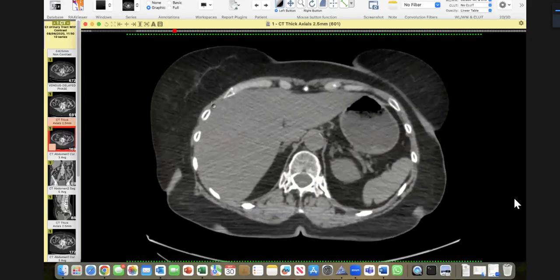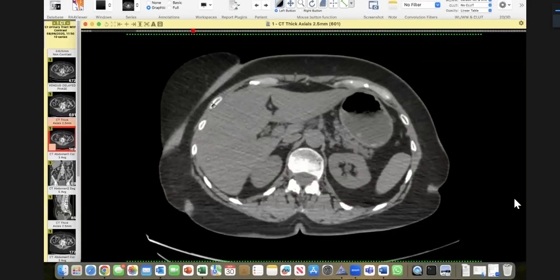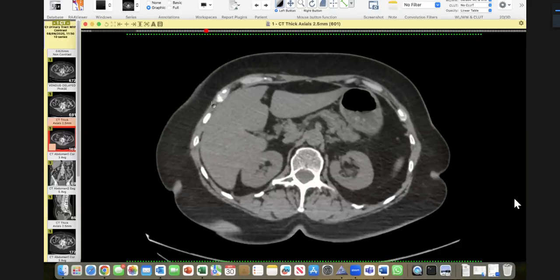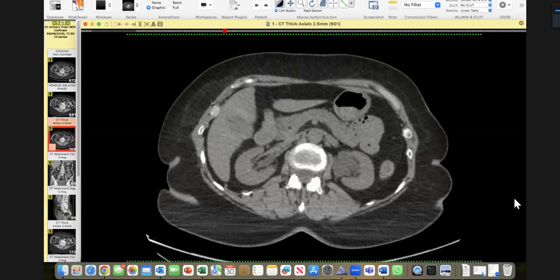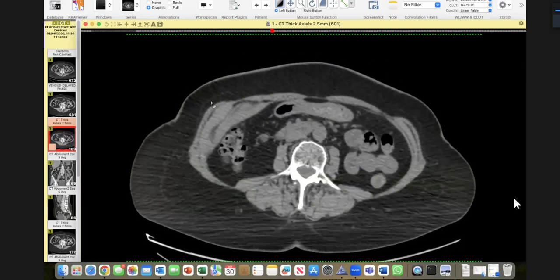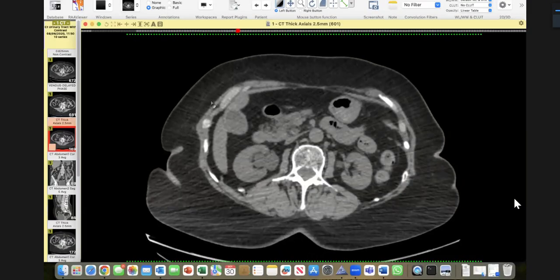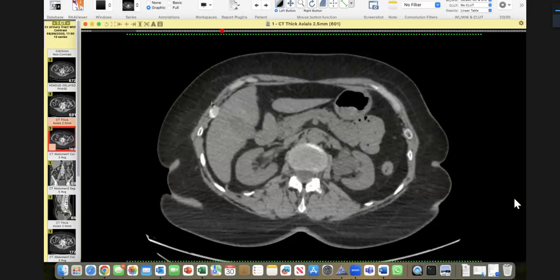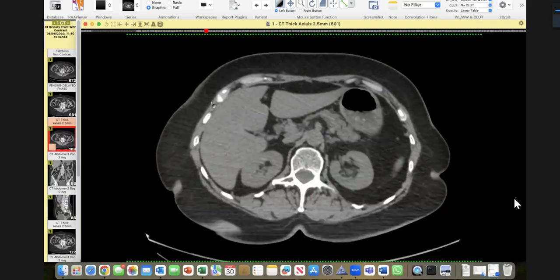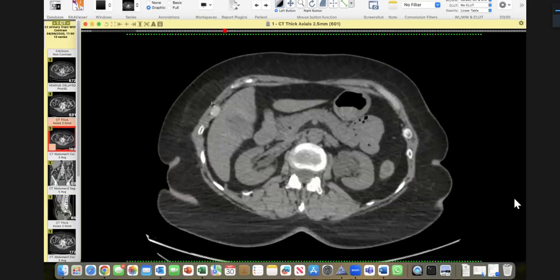Yeah, okay, sure. So I'm presented with plain axial cuts of CT images of the abdomen for a female patient complaining of hydronephrosis. I'm examining both kidneys. Both kidneys show a dilated pelvicalyceal system, however, the contents appear to be more isodense to me, more than of a fluid nature.